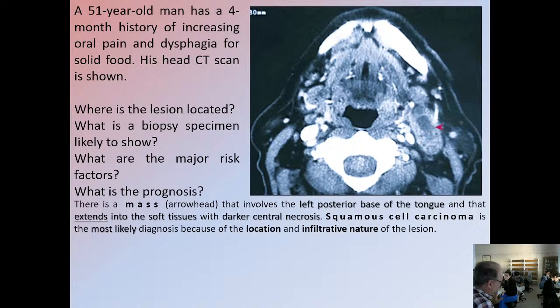So if we have a mass lesion that appears to be necrotic, this is suspicious for malignancy, because a malignant neoplasm can become necrotic because neovascularization is not enough to give enough blood supply to malignant cells, and they become necrotic. It's not for good that they are destroyed. It means that they are biologically aggressive.